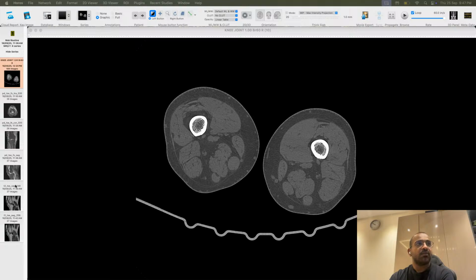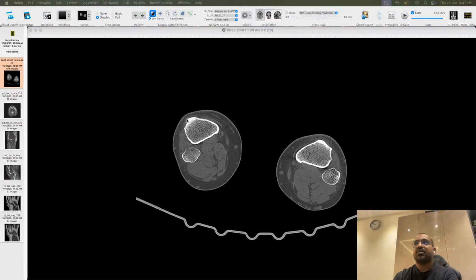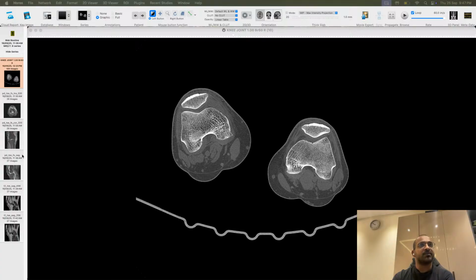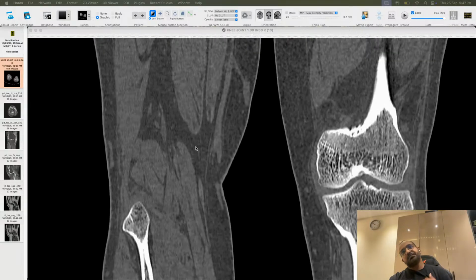So I have almost 3 PD, one screening CT. Screening CT was showing joint effusion. Quality of bone is good. No osteoporosis. No significant osteoarthritic changes in this CT.